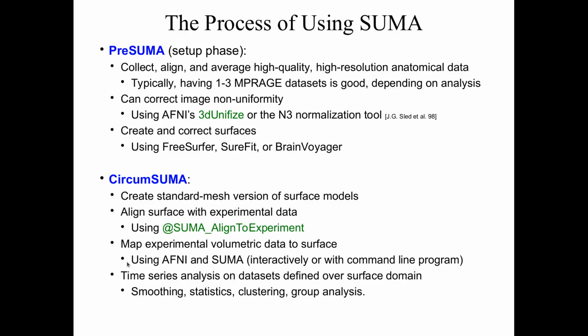In the same way, in AFNI, for every voxel we can think about storing a single number or a time series of data, like with EPI data. We can do the same thing with SUMA, and a lot of the programs in AFNI, like 3dcalc, 3dTstat, 3dinfo, will work on the surface data sets in the same way.